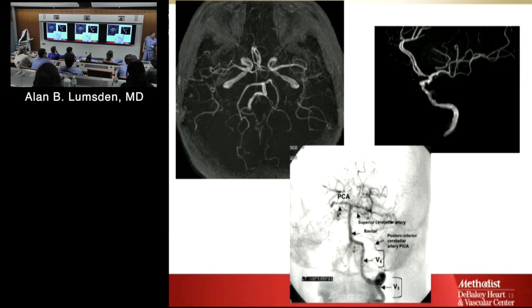What is that, Zolt? Fetal origin, because MCA is coming towards you. So because it's a lateral, posterior cerebral. Yeah, posteriorly, so it's a fetal origin PCA coming up from the carotid. Because when you look at the anterior, all the other branches will be MCA. So MCA would be all these, when it's coming this way, and you can imagine that this is what the bounds would be.